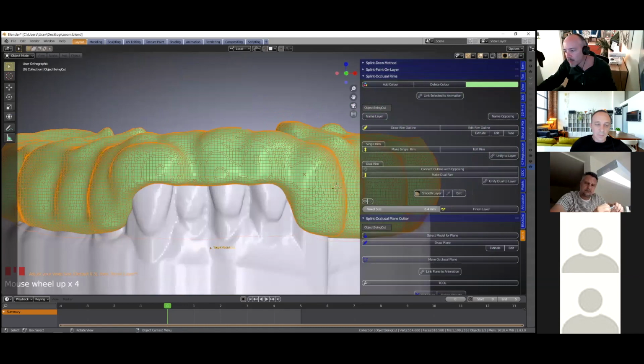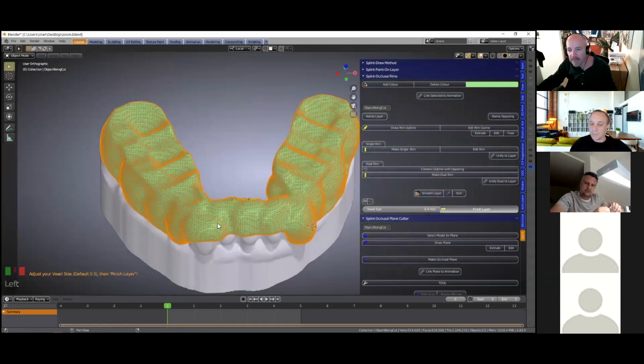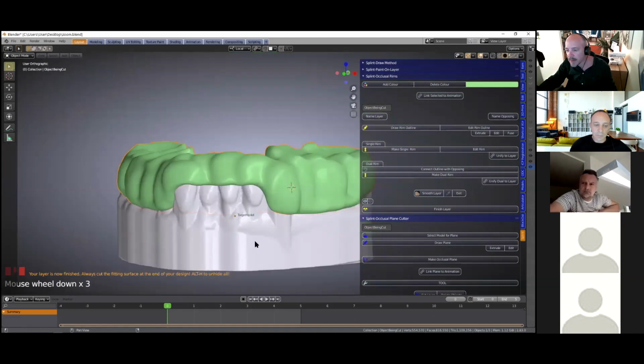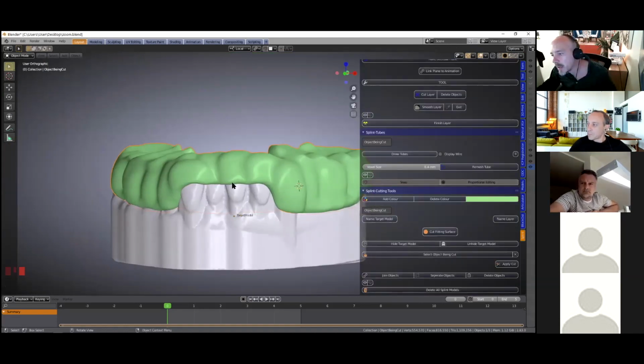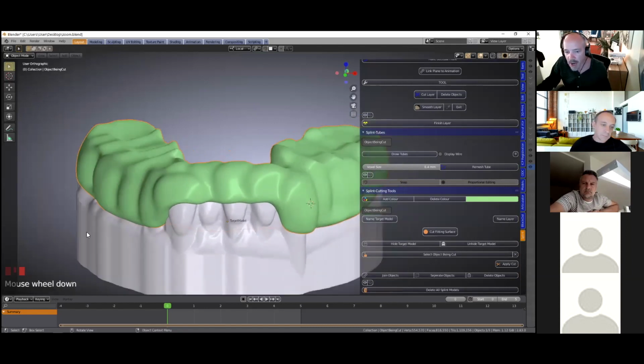And then we're going to finish this layer. And lastly, the very last thing is we're going to now cut our fitting surface, which is called the target model. But it's changed its name, because in the articulator, it's called object being cut. So if you try and do this and it doesn't cut, you will know that you need to call this layer target model.